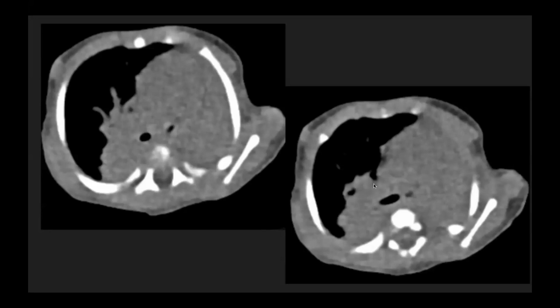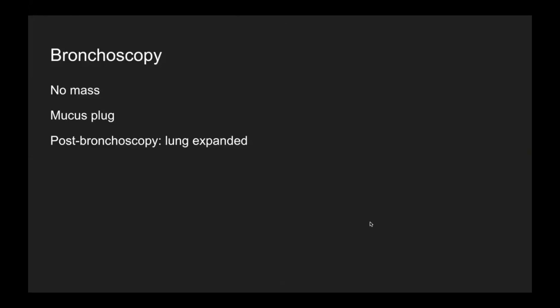So there was dependent location consolidation on the right lung as well. A bronchoscopy was planned, and bronchoscopy was done. It is really difficult to do bronchoscopy in such a small kid. So we have to give a reasonably good diagnosis to the pediatrician so as to intervene.